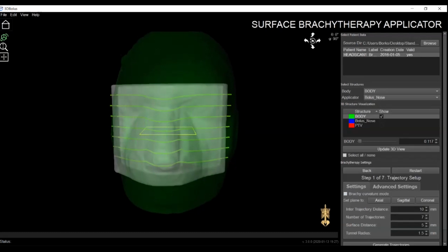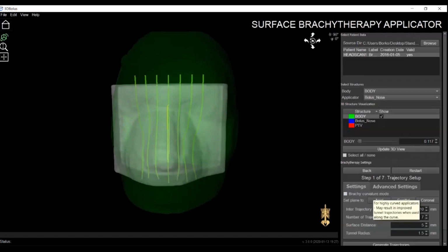Okay, so besides these features that I'm mentioning, we also incorporated a new UI UX design. It's very similar to the old one, but there are a few very different and, I would say, much more user-friendly features that we incorporated. One is what we call the hand-holding of a user, where we incorporated these steps, 7 steps, where we are currently in step 1.